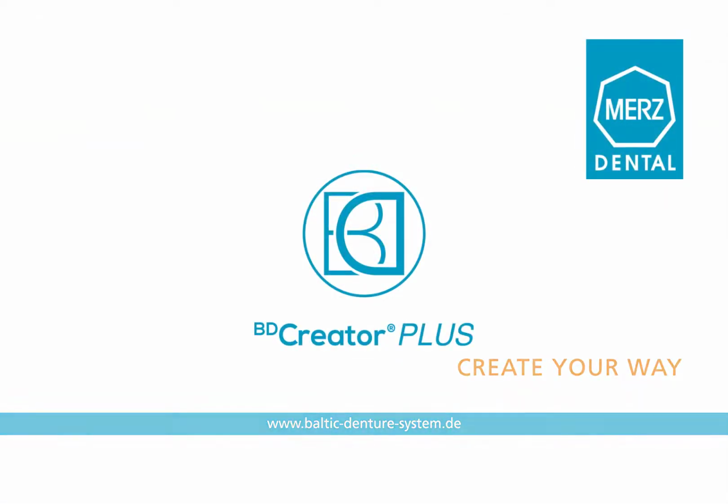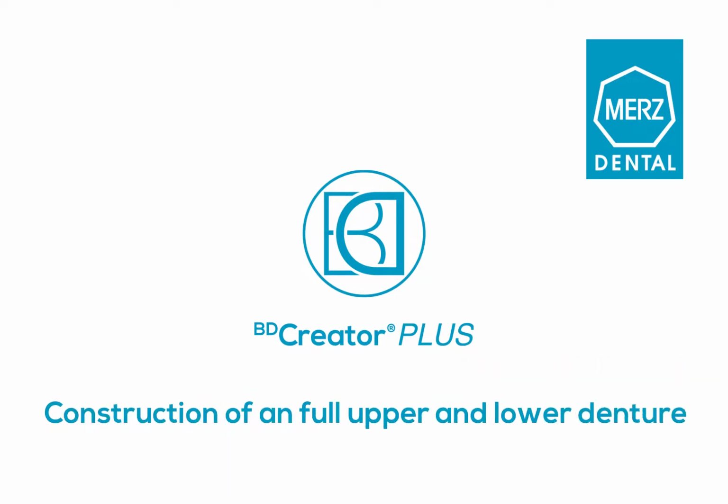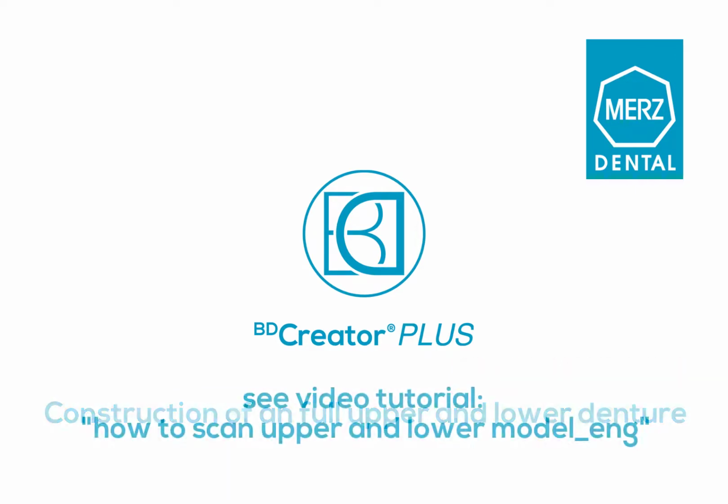This video shows the construction of a full upper and lower denture with the BDCreator PLUS. The data of the situation shown was created and exported with the DScan 4 scanner.